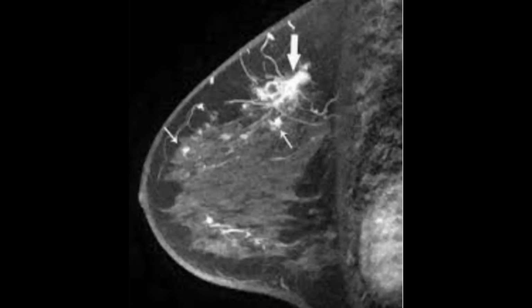Another last point that you must keep in mind is that the sensitivity of ultrasound for detecting ductal carcinoma in situ is significantly lower than mammography. Therefore ultrasound should not be used as a screening tool for the detection of malignancy, especially microcalcification. However, if you are expert enough, you may be able to see the calcification and raise the concern.